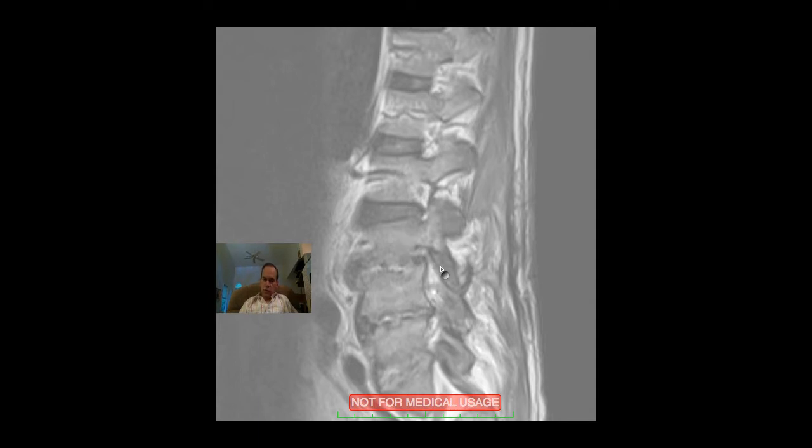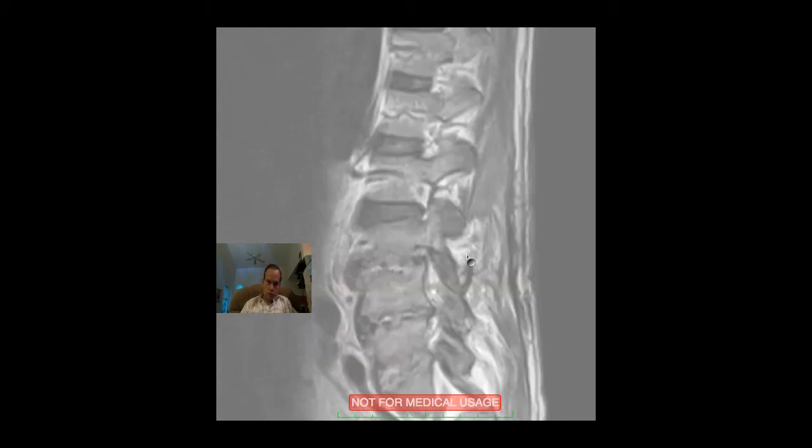So this is severely narrowed, and part of that is from hypertrophy and degenerative changes at the joint of Luschka, this articulation between the actual edges of portions of the vertebral bodies, and often the facet joint also becomes hypertrophic, and that encroaches upon that neural foramen as well here, only a mild degree in this case.